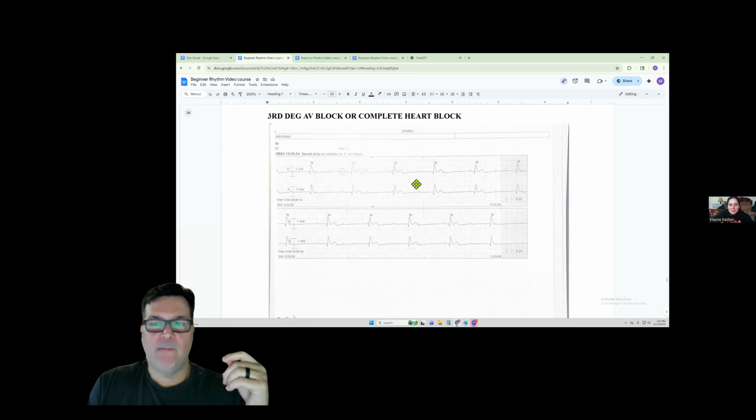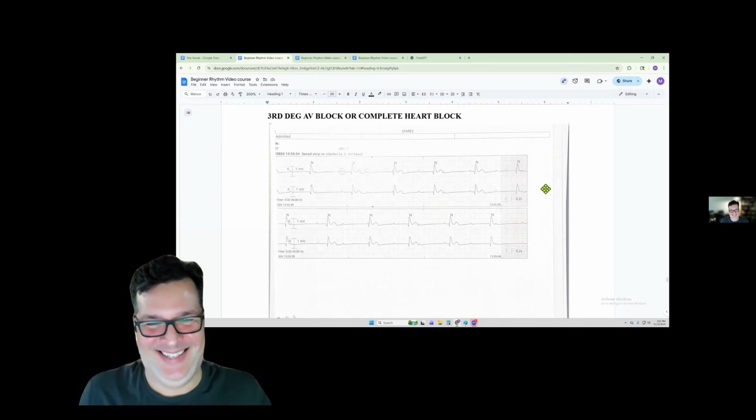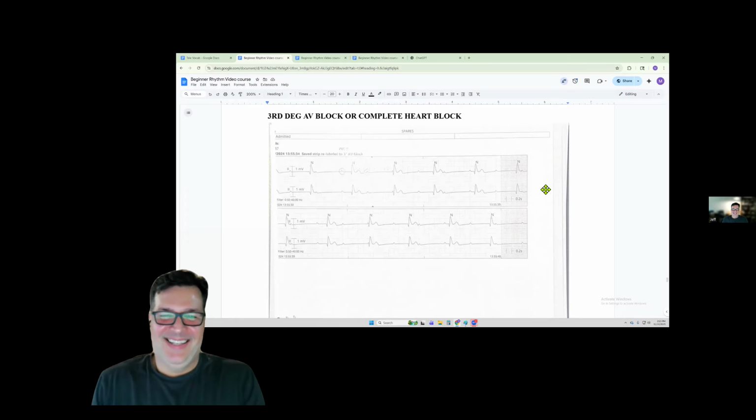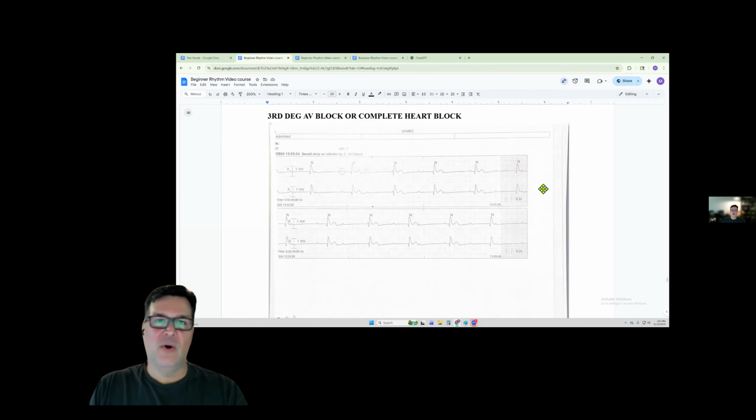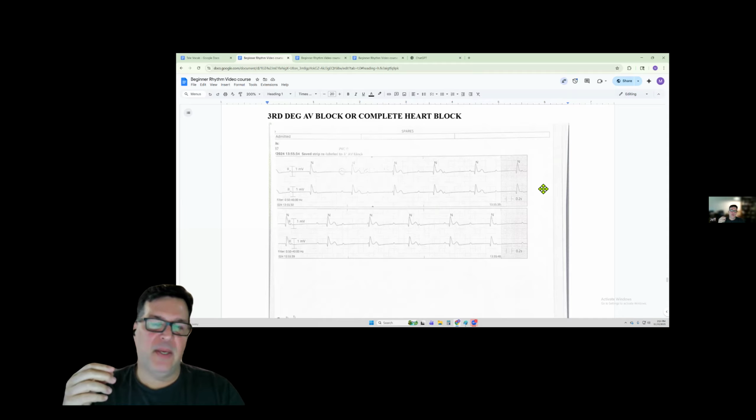I'm with you, but that's just really cool. It's cool to watch. It's not cool for the patient. So again, it's that bundle branch area problem where instead of sporadically dropping a beat like a second degree type 2, it completely stops all communication.